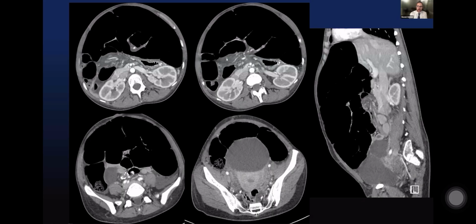This is a patient who had a chronic debilitation. She presented over and over again with a small bowel ileus. She actually didn't have a mechanical obstruction, although she did have some twisting in her small bowel mesentery. They decided to go ahead and treat her conservatively, as they always did.